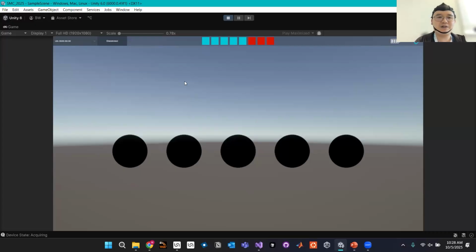And then when we get the classifier here, you see the red dot. The red dot means that the classifier is bad. In the future, you will see a yellow dot, also called orange dot, and a green dot, which mean the classifier is okay and the classifier is perfect. I recommend everybody to start the game when the classifier is perfect, because the worse the classifier is, the longer it takes for you to select an object.